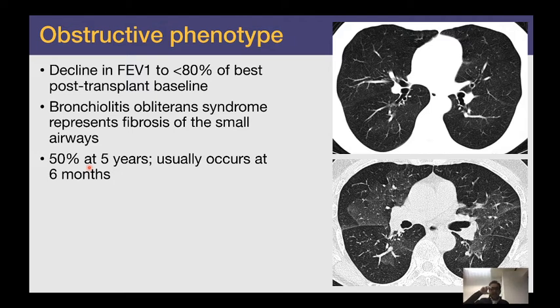Bronchiolitis obliterans is a disease in which the small airways of the lungs become fibrosed and obstructed, and early in the stages of bronchiolitis obliterans, the only finding that you may see is air trapping. So if you just have an inspiratory image, the lungs may look completely clear. Okay.